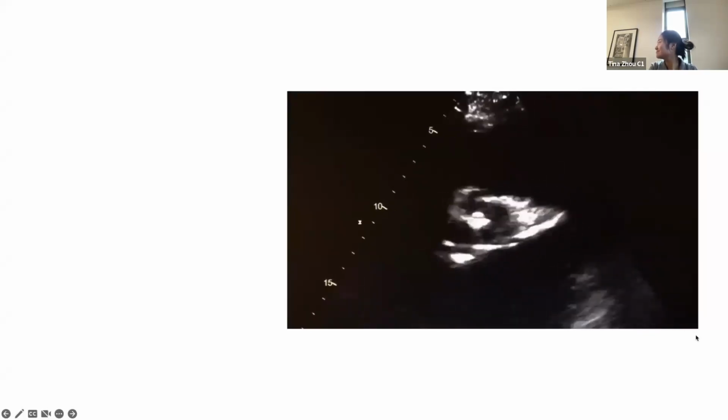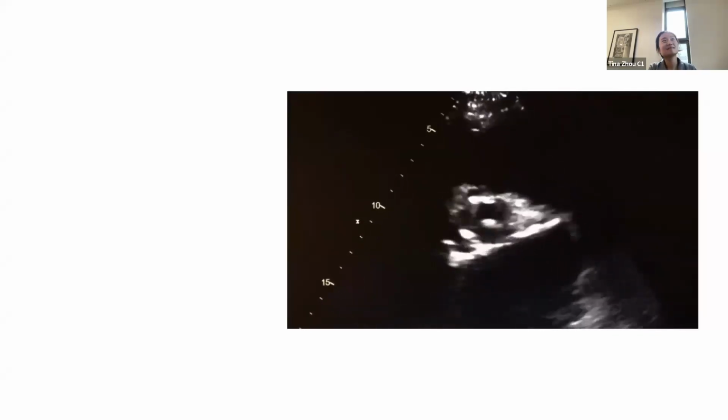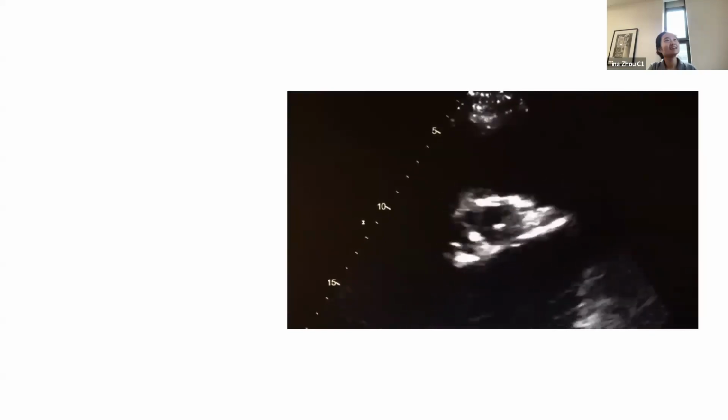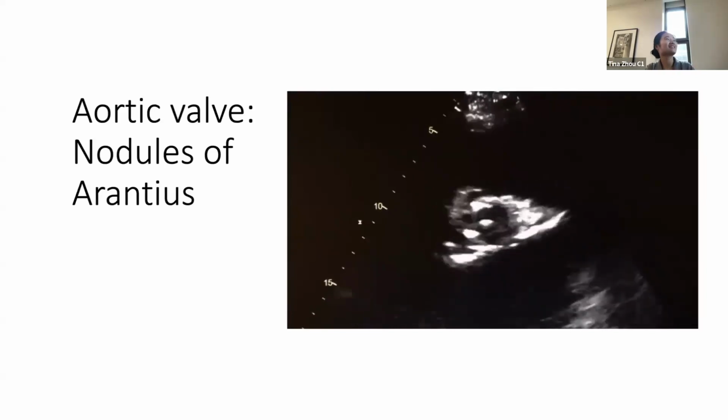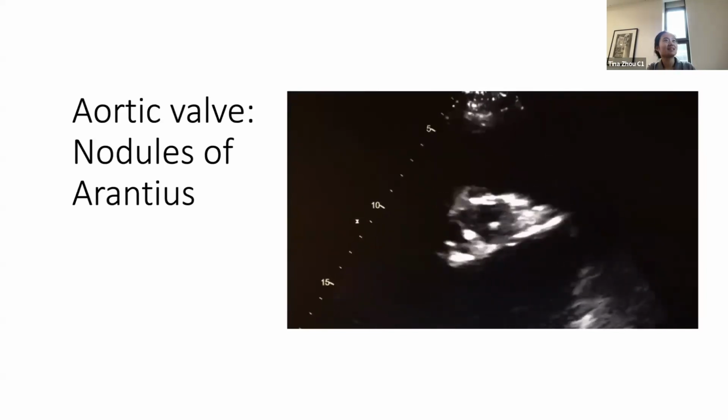Thoughts? These are... Sorry, I didn't hear what you said. Yeah, nodules, yes. These are nodules of Arantius.